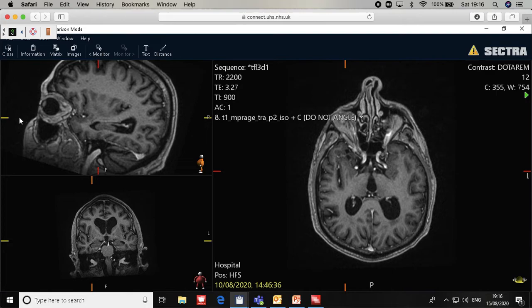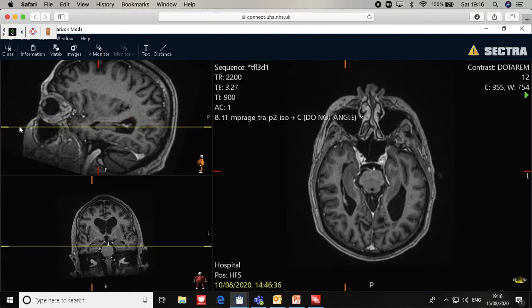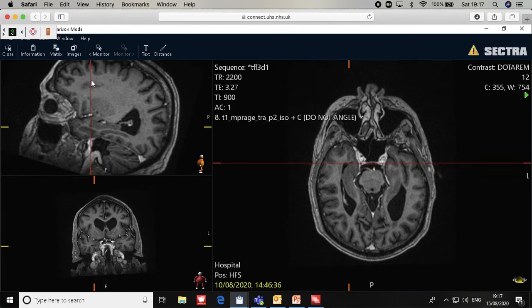So all I had to do is to bring this down there. Okay, so you can bring the gray matter in the sagittal view here, so you can see that this will be the hippocampus, and you draw it here, you see it there. If it ends, you have to be very careful with anterior to it. Don't draw anterior to it. So for example, if I go anterior here, we're still there.